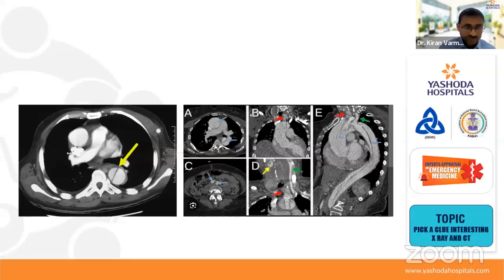This is the CT. You can see the false lumen. Here is the yellow marking. That is the false lumen. Then on the right side, if you see, dissection from the arch of aorta till the bifurcation of aorta. So which classification of aortic dissection does it come under? Think in terms of Stanford. A or B? Stanford A, Adil, right? Rimi, Baba, Aisha. Yes, this is Stanford A.